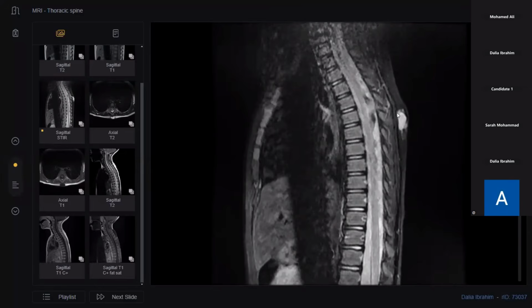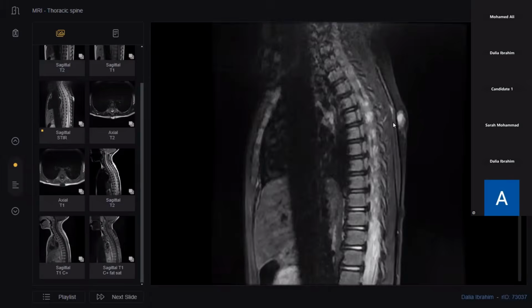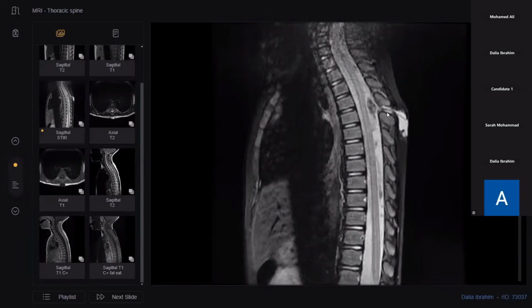It's like a separate lesion, or like Dr. Rami Edward described it in the conference. It's like an entrapped myelomeningocele. Okay, not communicating, but we do have a fibrous stalk communicating with the spinal cord. So this is a subtype of spinal dysraphism, but not with myelomeningocele. Some radiologists call this dermal sinus tract, and we will discuss later if this is a diagnosis or not. Thanks, Dr. Amna. I will proceed with the next case.